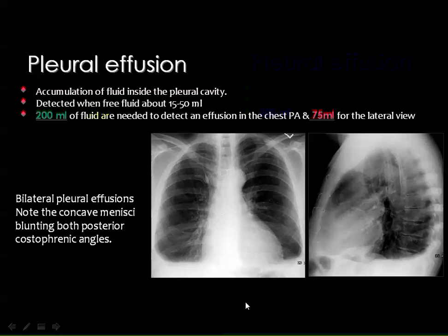Then, as I have said, we usually suggest the possibility of tuberculosis whenever we see calcium in relation to the pleura or to the lung. But you know that asbestos plaques may also show some calcium, and plaques secondary to any other disease may also show some calcification.